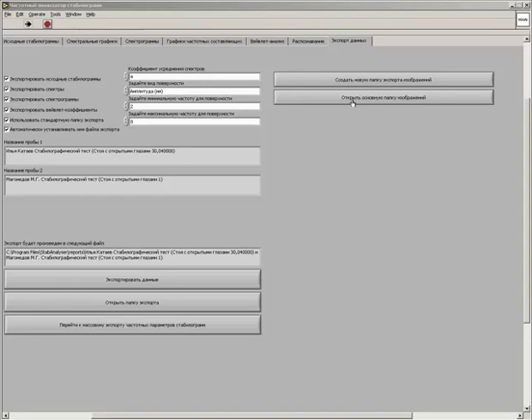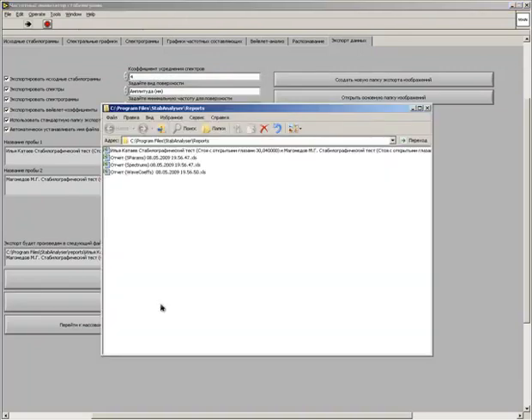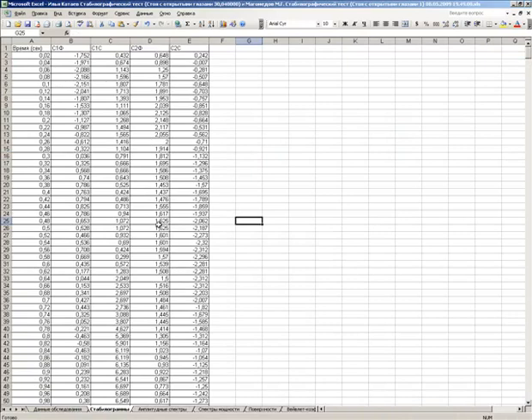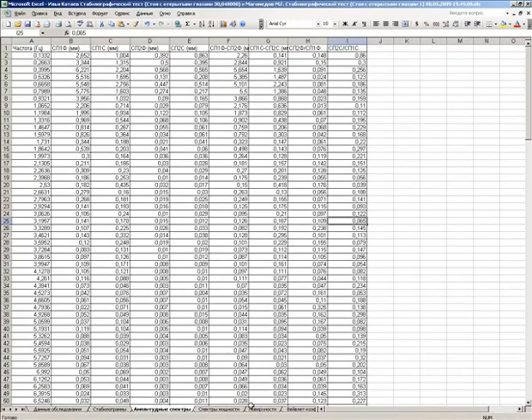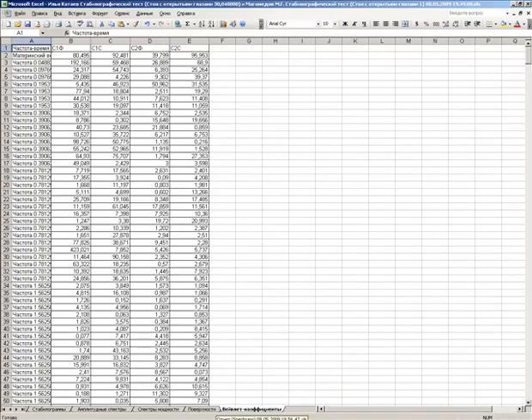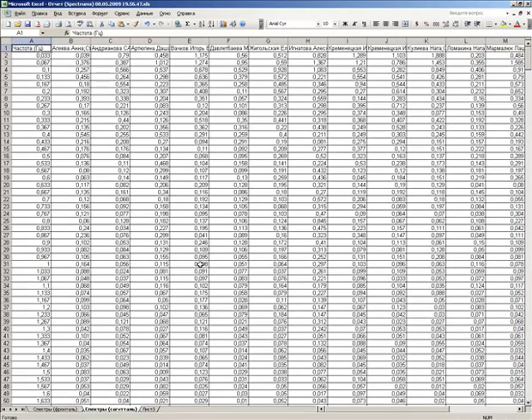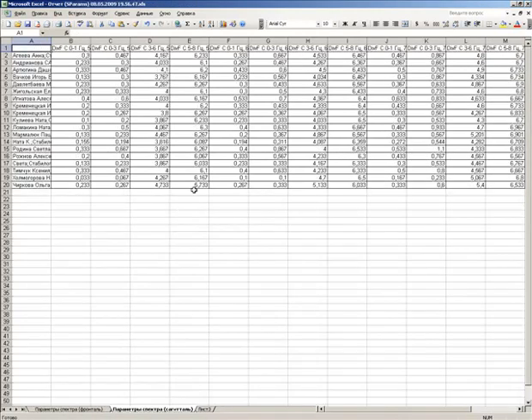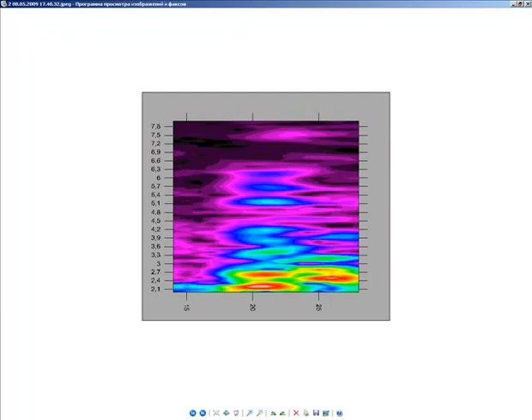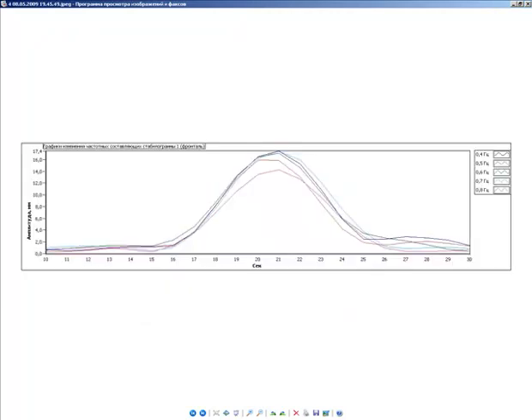As you remember, during the demonstration I saved a few pictures as well as performed the export of the signal's characteristics. Let's look at the results. This file contains the full details of the subjects, the initial signals, estimates of the spectral density of the signals, the values of spectrum evolution surfaces, as well as the wavelet coefficients. These files store the spectral densities of signals, the characteristics of spectral densities, as well as the wavelet coefficients for a given sample of subjects. And here are the saved images which may be useful for researchers as illustrations for the preparation of articles.